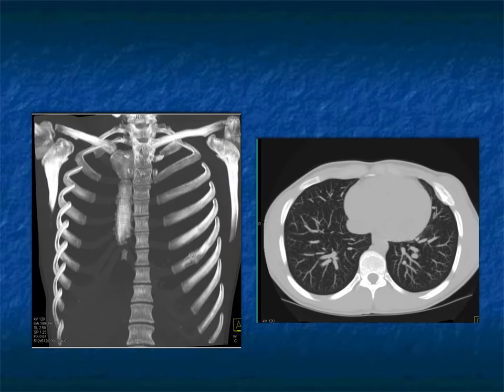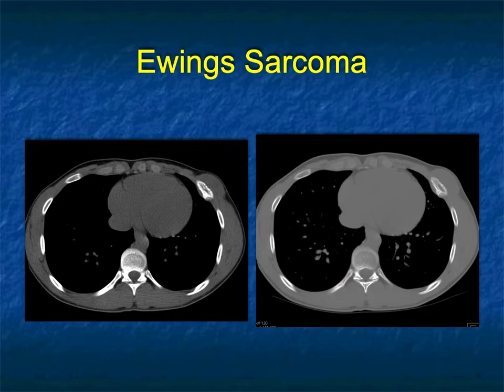And this is the look. Here's the bone, that one rib involved. This was a flat bone. We talk about osteosarcomas of ribs, they have matrix. We talk about Ewings, flat bone, smooth, destructive, without matrix. And this was a great case of a Ewing sarcoma.